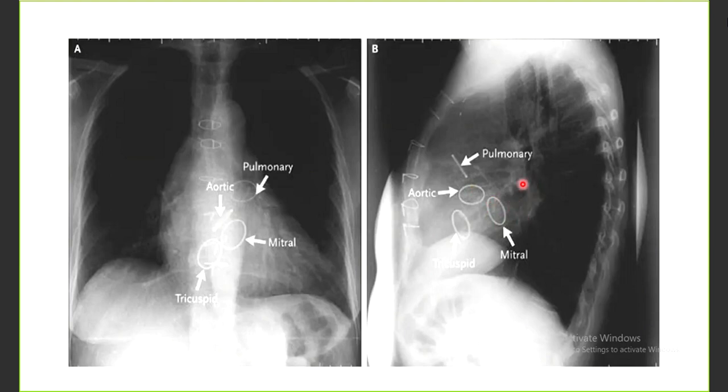When the left atrium is the posterior-most structure, then the mitral valve will be draining the blood from the left atrium to the left ventricle, and from there it goes into the aorta. The RV is the anterior-most structure, and hence the pulmonary valve will be seen somewhere here, and in PA view it will be seen somewhere close to the pulmonary bay. And the tricuspid valve, almost always the prosthetic valve will fall on the midline, or it will be seen as the lowermost prosthetic valve if the patient has multiple prosthetic valves, and in lateral view it will be very close to the diaphragm.